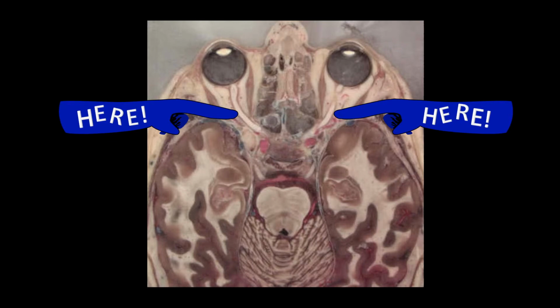The conclusion is that the pathology is likely to be prechiasmatic, that is bilateral optic nerve disease, because postchiasmatic lesions are less frequent and a more extensive area needs to be covered by them in order to develop bilateral disease. It is important to remember that the visual pathway in the retrochiasmatic area occupies a much wider area than in the prechiasmatic area. Also, since latency was affected and not amplitude, the optic nerve pathology is most likely demyelinating.